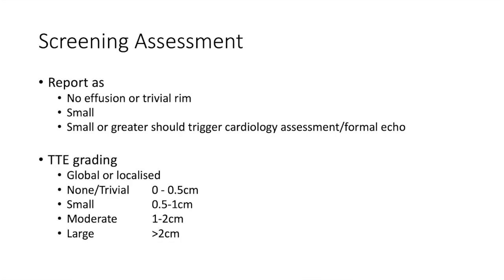Small would be 0.5 to 1 centimeter. A moderate amount would be 1 to 2 centimeters. And anything greater than 2 centimeters would be considered large and would be potentially a medical emergency. I would advise you to get an urgent cardiological opinion if you see a pericardial effusion that's greater than 1 centimeter.